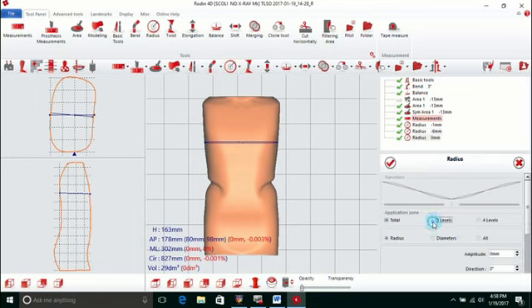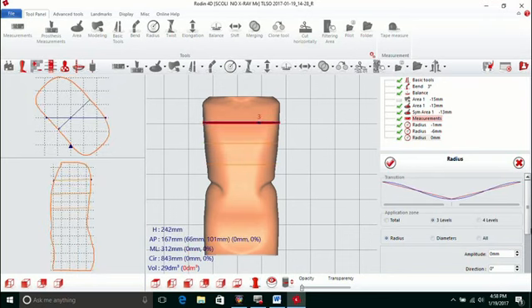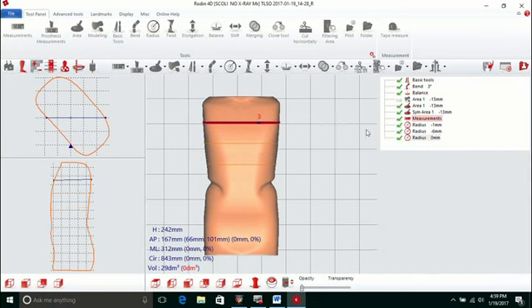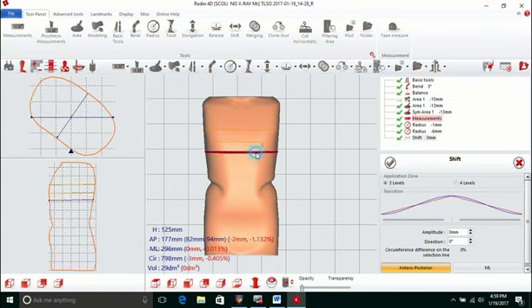Top view, alrighty, and one more thing we'll show you with the radius tool. Left click, 3 levels, 1, 2, 3. There's also a symmetry, meaning, let's say I click left in symmetry. Now I have my application zone already applied. Now you can see with symmetry, what happens to the left happens to the right, or if you uncheck symmetry, you're able to make a push just on one side. There again, if you had to make a push, you could also use the shift tool, ML, and you can make your shifting as well.